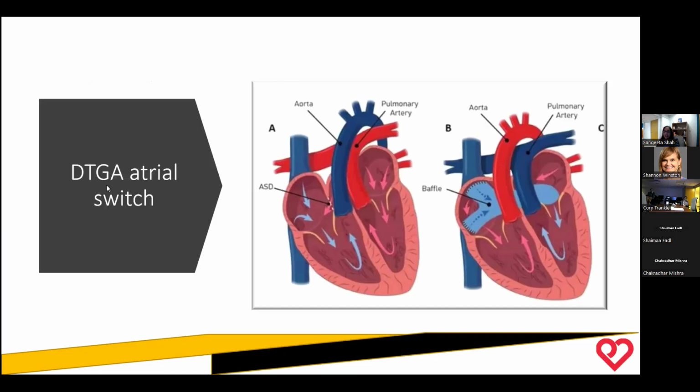So I'm going to focus on the atrial switch. What's an atrial switch? Baffles always baffled me, to tell you the truth. But the way to really think about it is a baffle is any rerouting, wherever the rerouting is occurring. And you have the SVC, and the surgeons rerouted that through a patch, took the IVC, rerouted that through the patch, through the atrial septum, focused towards the mitral valve.